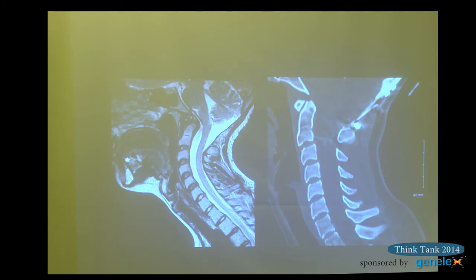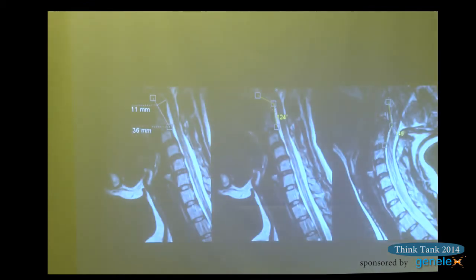This is somebody post-op who wasn't stabilized, and again had abnormal clival-axial angle with impingement. Again, showing someone else. Can you actually see the structures here? From my angle, I can't. But it's a Grabb-Oakes measurement of 1.1 centimeters, clival-axial angle of 124 degrees.